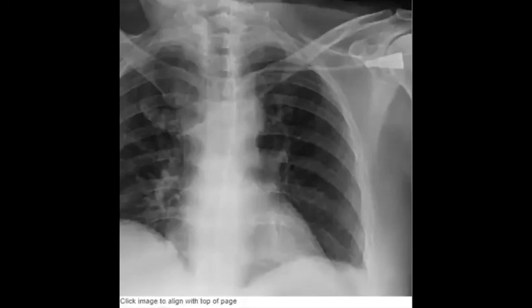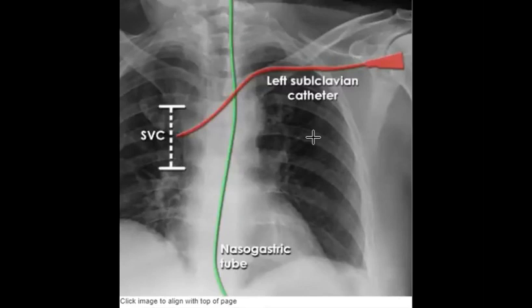And finally, what happened here? Is it good or not? From the left side here. It is not good because it should not be horizontal. Yeah, it goes like this.